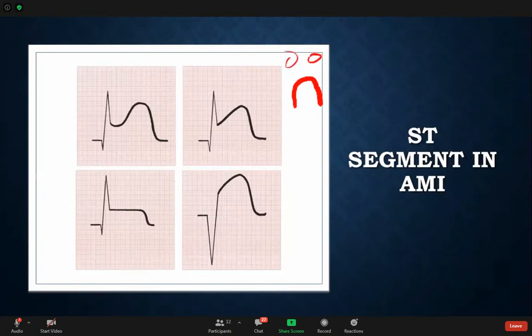If you imagine it's a face, that's a sad face. But this represents acute myocardial infarction or STEMI. Okay. Another comes like a check mark. Also it represents acute myocardial infarction. It has this shape.